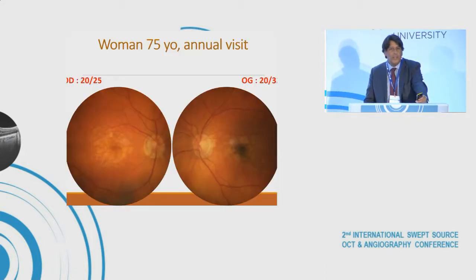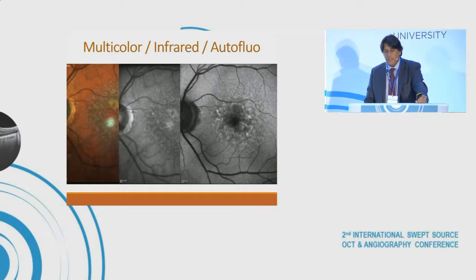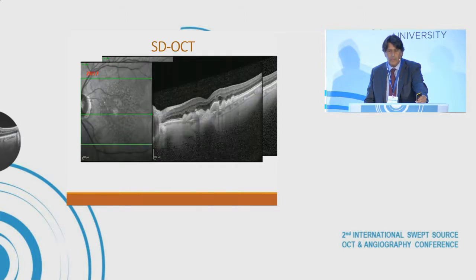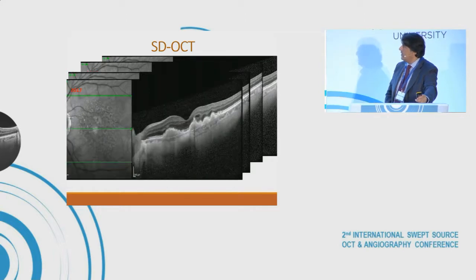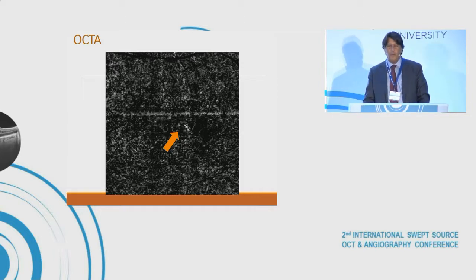Some other real-life cases. Here, patients that come for annual visit with some drusen. It's just a lot of drusen, with pigment changes in both eyes. When we performed last year and this year the SD-OCT slides, it does not change. Below, here, a small change, last year, this year. Let's see another line. Last year, this year. Yes, there is just a small cyst on this patient, and OCT-A can detect a minimal flow, but we are not sure about what we see on this en-face image.